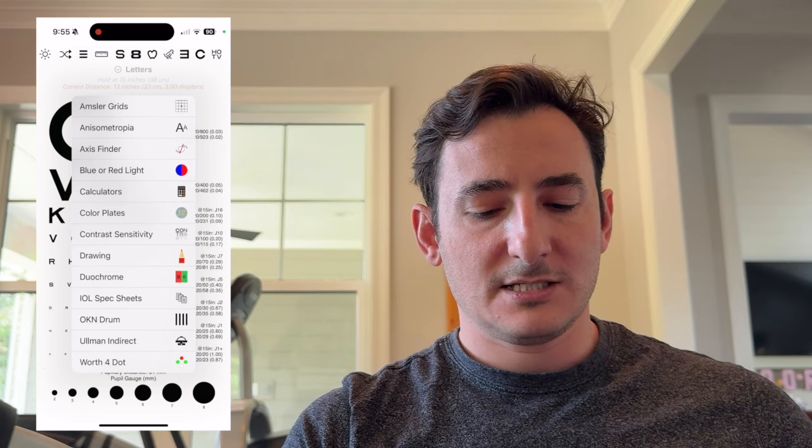Okay. Next up is the contrast sensitivity chart. Again, familiar navigation bar. So the screen brightness, shuffle, and answer buttons are all there. You can see the shuffle button works. When you touch the info button or the answer button, the contrast goes to 100%, so you can quickly verify what the patients should be seeing.